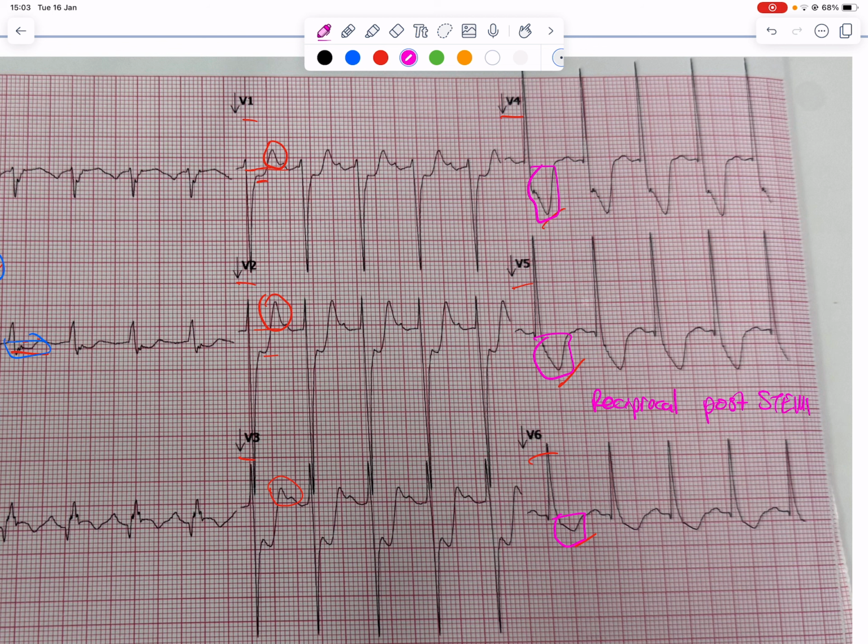So you're having an infarct in the posterior portion of the heart, and all of that ST elevation that would be seen at the posterior portion, if we had those leads at the back, when you look from the leads in the front, you're seeing the mirror image of that, and that's why we're seeing this reciprocal depression over there. And then the changes that we're actually seeing here in V1 and V2, horizontal ST depression and peaked T waves, are actually the posterior MI being seen from the anterior portion of the heart. And I'll make a video about that at a later stage.